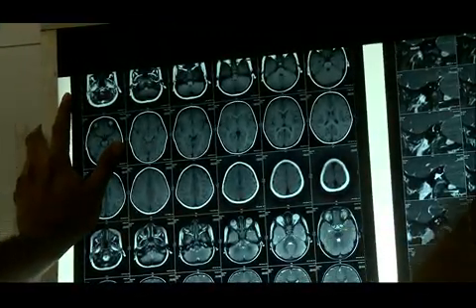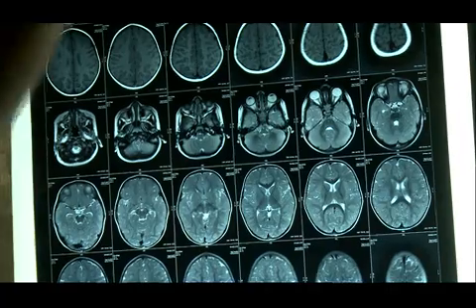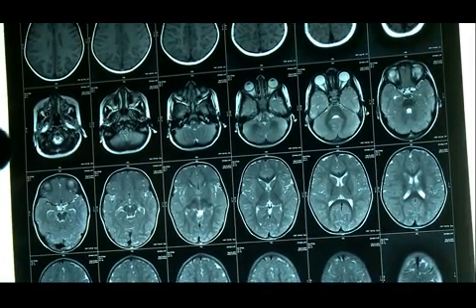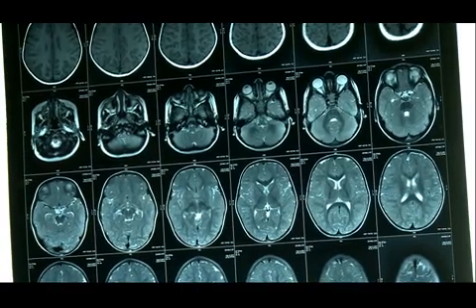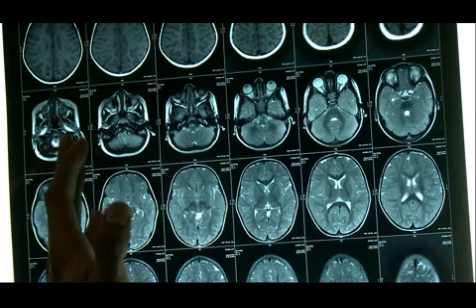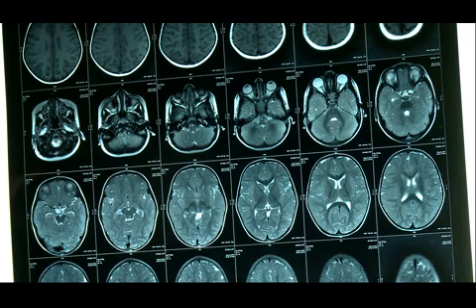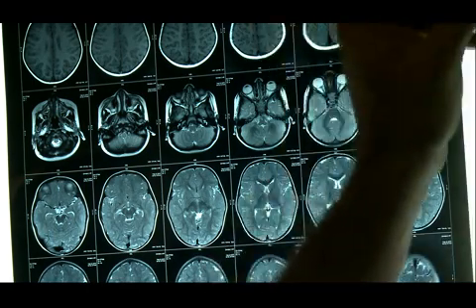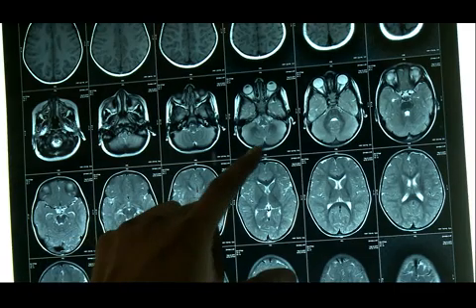On MRI, like CT scan, you can start seeing from above to below. You will see the internal auditory meatus. What we need to see on MRI here is the nervous architecture of the nerves in the internal auditory meatus, the cochlea, semicircular canal, and all those things which are part of the labyrinth. Out of all malformations of the labyrinth, the commonest is the lateral semicircular canal malformation. But it doesn't affect our cochlear implant surgery much. But it can affect the course of the facial nerve. So that is always something to keep in mind.